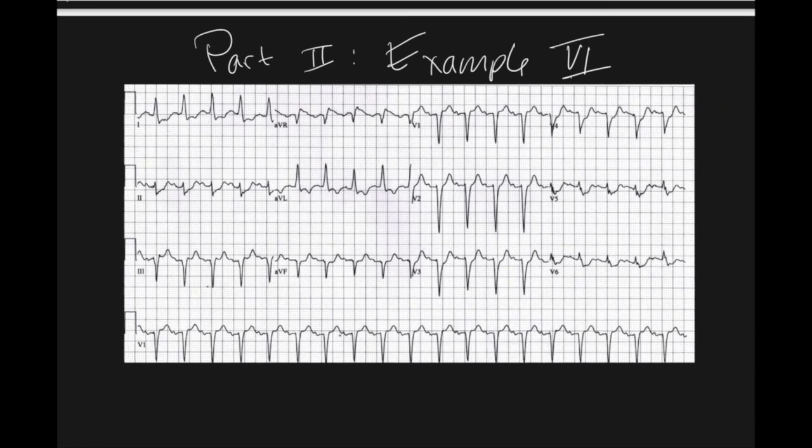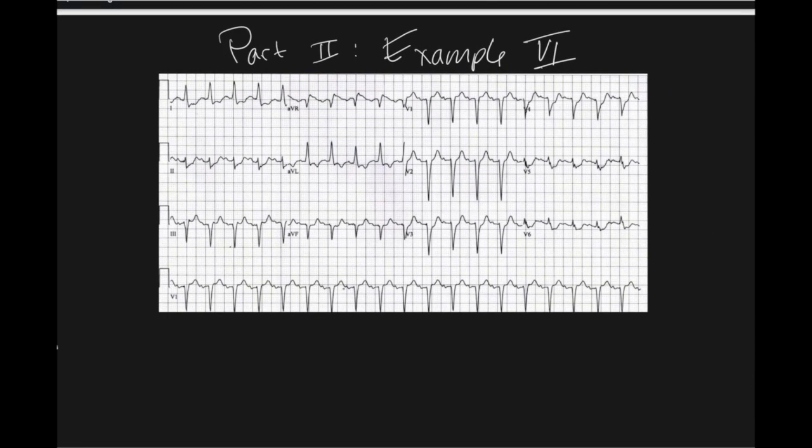Alright guys, welcome back. So let's go through that 5 pattern again. So pattern 1, we have that left side is mostly negative, and right away we see in lead 2 that that's not the case. So nope. Pattern 2 was that AVR is mostly negative, and we see that our R wave is bigger than our Q wave, so that's going to be a nope as well. Pattern 3 is that AVL negative P negative T, and that should really be the only one that does that, along with AVR. And we see that, well, for what it's worth, that's mostly true.